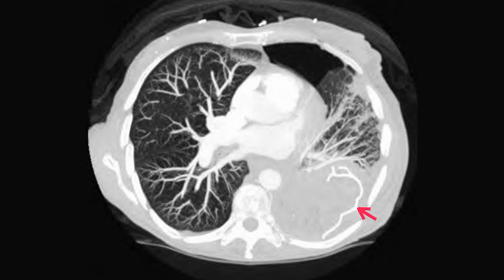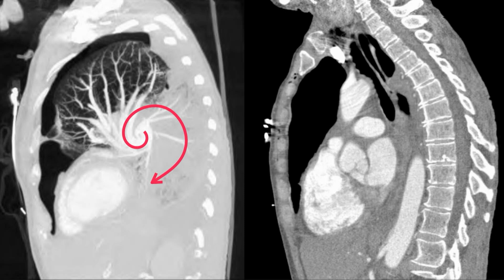The lingula is now completely consolidated, and the lower lobe is now very anterior. So we were again concerned about torsion. Unfortunately, this is a video, but you can't see it play. But what this shows is this spiraling effect of the central pulmonary arteries. In a normal pulmonary artery, it just drapes. It takes an oblique course with branching. But with torsion around the vascular pedicle, you get this spiraling effect of the vessels.